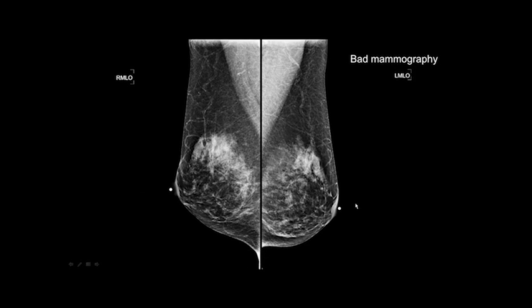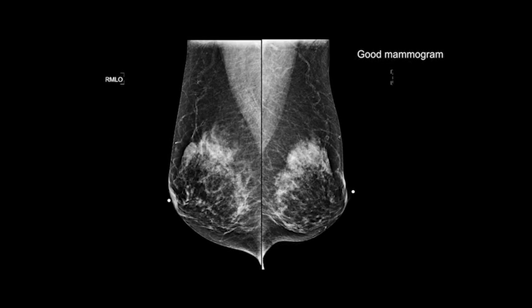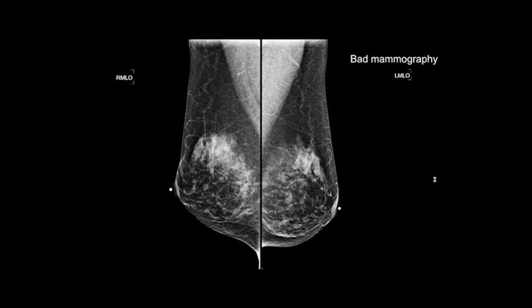There's none. The same patient by a different technologist, they got a little bit more muscle. You do have 45-degree angle to muscle. IMF on both sides, but look at the difference. You see these breast structures here. You see the horizontal nature. They're well separated here, but you have to get this retroglandular fat here compared to the previous view.